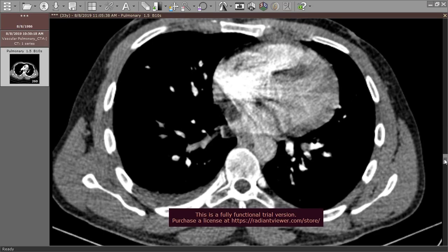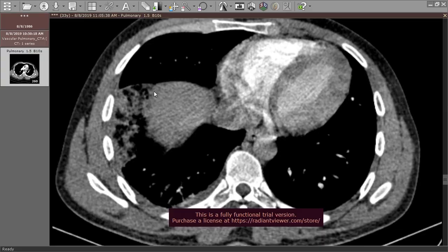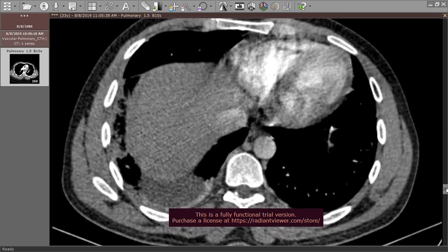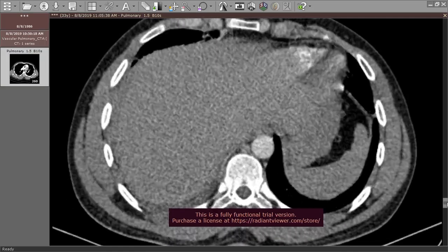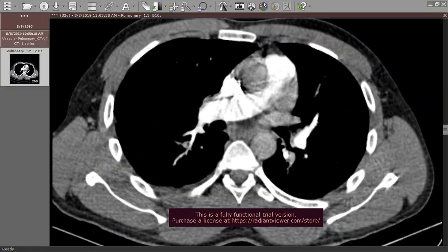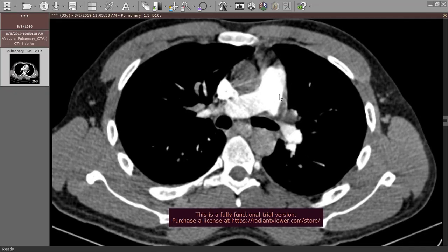When we trace these non-opacified vessels, we will find this wedge-shaped, pleural-based lesion with a bubbly appearance. It represents an acute pulmonary infarction, and of course it is accompanied by a recent minimal pleural effusion. So it's a case of acute on top of chronic thromboembolism. At last, you have to see the pulmonary artery itself and measure its caliber. It's not dilated.